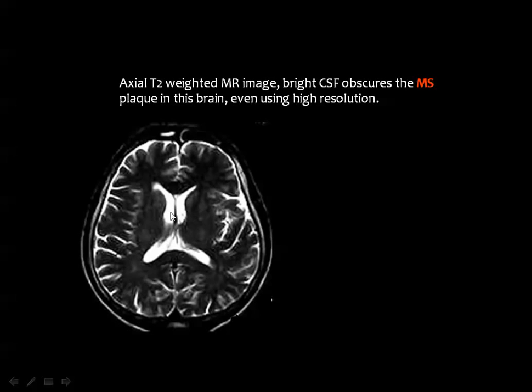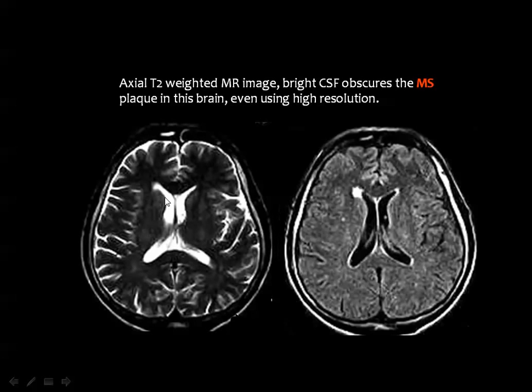And this lesion, because of its water content, will appear black in the T1, similar to the ventricle, and bright in the T2, similar to the ventricle as well. But look at the FLAIR image, and the lesion will appear bright because this is a T2 image where the CSF will appear black, because this is a fluid attenuation image.